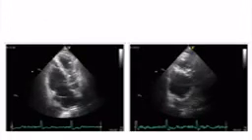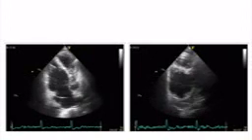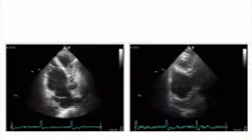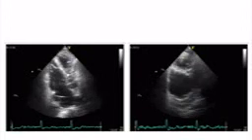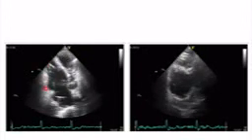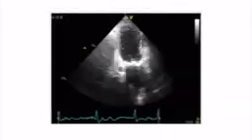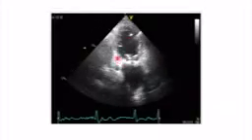And here's another case. This time, again, a 4-chamber view, which is optimized for the right ventricle. And if you look closely, you will see again that the right ventricle is dilated and function is very poor. The wall is not thickened, though. Why does the patient have this? Well, again, we need the clinical information. We know that the patient had an inferior infarct.